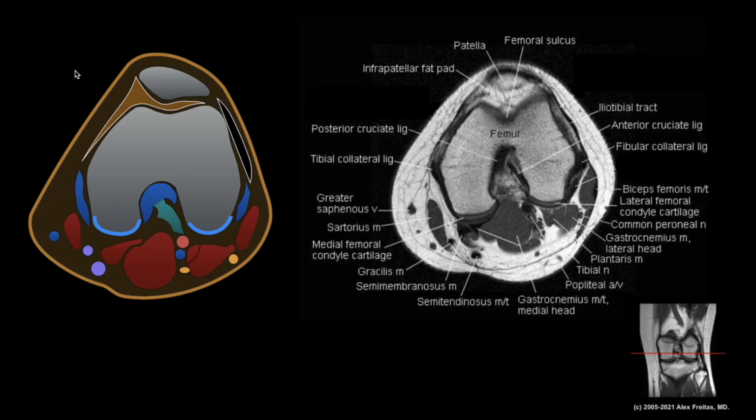This is what I schematically created. This is the level where the cut is made. So this is the femur, and then we're going to move down. It will be the meniscus and the part where we see the tibia and the fibula together. So here is the red line. So this is the MRI picture. I'm going to talk about these structures counterclockwise. So here at the top we can see this is the anterior part and this is the posterior part.